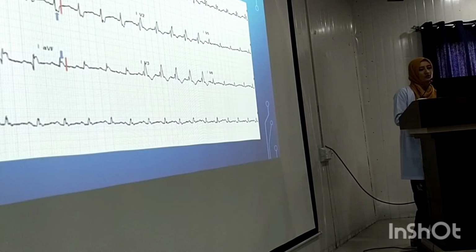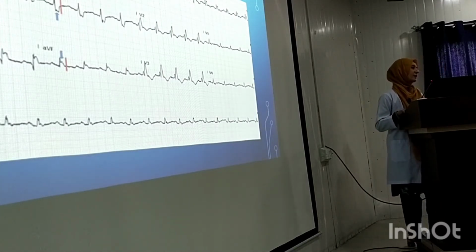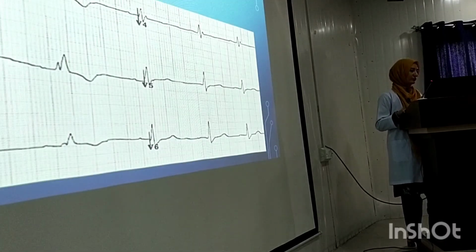This is another ECG of right bundle branch block. I think it's a 12 lead ECG. This will make our job easier. Just have a look at lead V2 and V3 in this lead. This looks like the ear of the rabbit if you can see it.